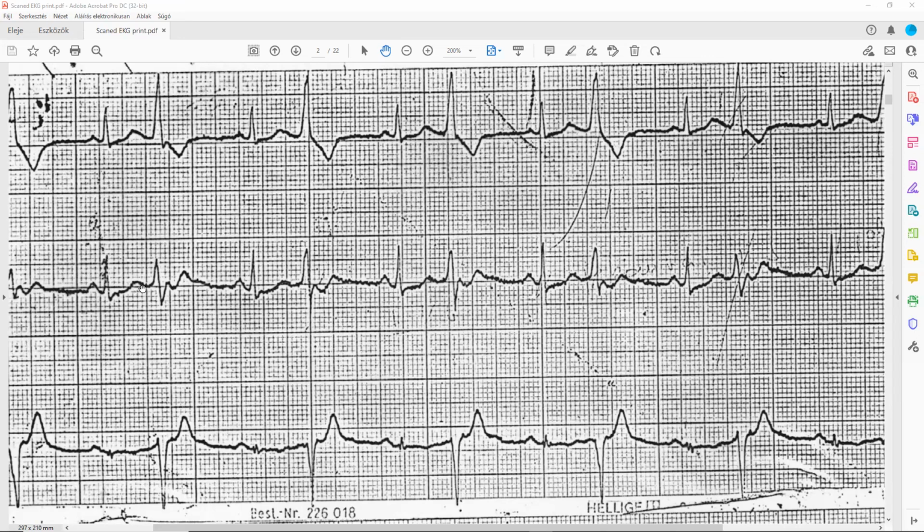This is a T wave. There is no P wave in front of it. The QRS is wide. As you see here, this QRS is not the same as this one. If you look, this is coming earlier. So even the amplitude is different. That's a P wave, then a QRS, and this is a QRS as well. Okay, I got it.